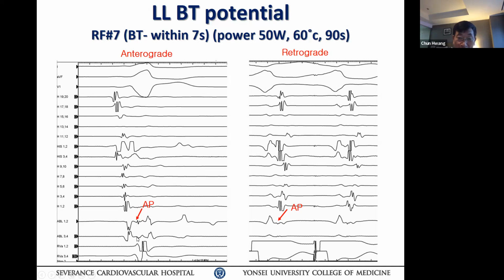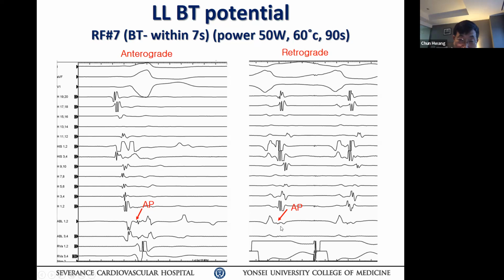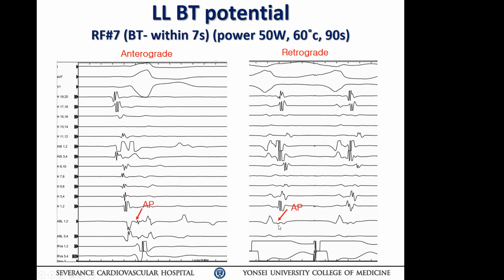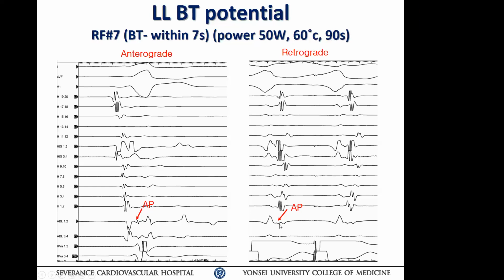So anyway, you did retrograde pacing, then what happened? This is retrograde pacing. And then did you do premature pacing, the same maneuver as you did during the tachycardia coupling, or no? No. You should have done that to prove yourself. Why? You want to see pure left eccentric activation through the left lateral pathway to reach the conclusion that that's an accessory pathway. Otherwise you cannot. Okay? That's what I'm trying to tell you.